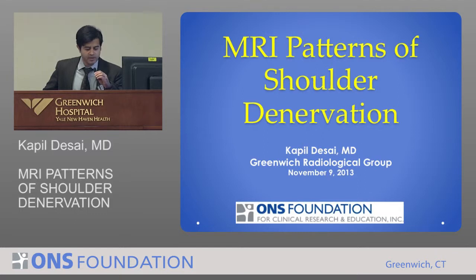For the next 10 minutes or so, what I'd like to do is to talk about MRI patterns of shoulder denervation and try to show you how your shoulder MRI might give you a more sophisticated diagnosis than just your typical rotator cuff tear or labral tear.